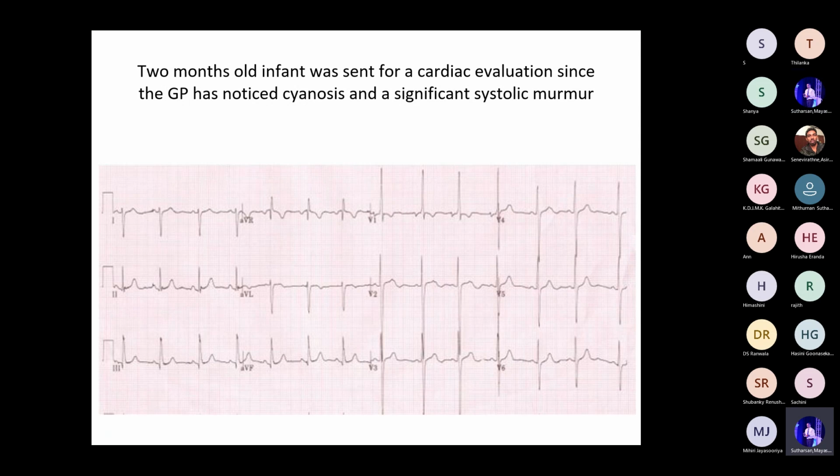What is this? Common. So why is it not moving? Why is it not moving? So what could be the diagnosis here?